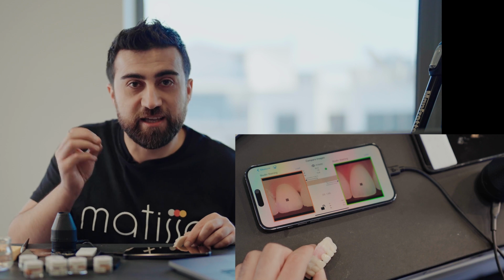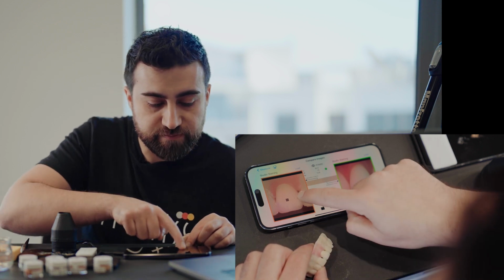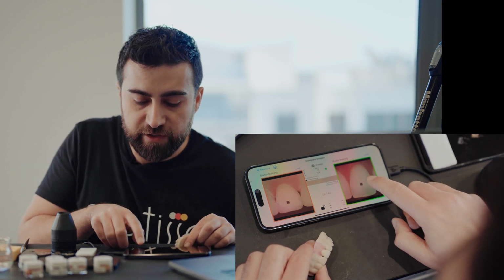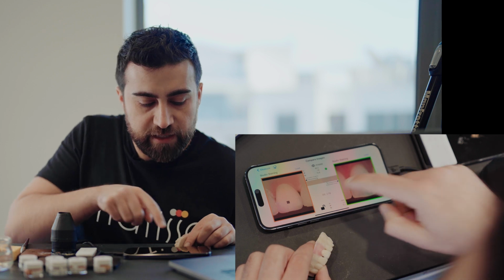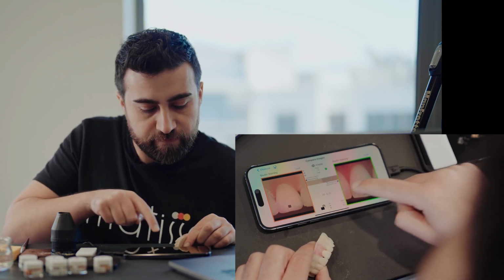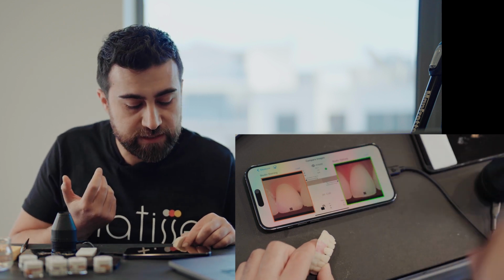It's really amazing how quickly and precise this works. Starting from a white background, painting it to whatever color you need, painting it to whatever color you want. Yeah, so this is going to be my first bake, and then after the bake I can work on more details. So you can use different techniques with Staining Studio.